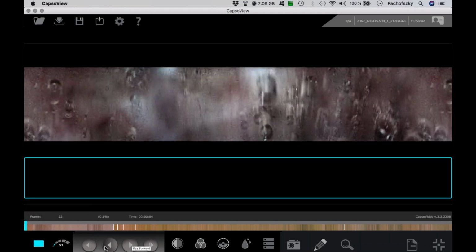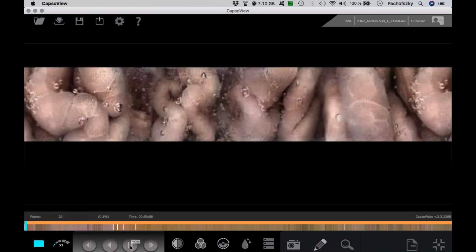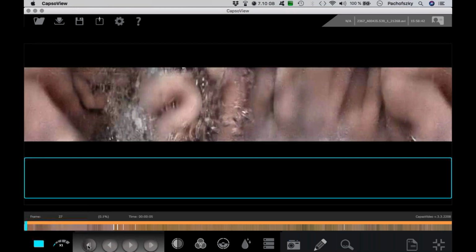So what I forgot to tell you, we have here also the possibility to mark the first esophageal mark. So we will do it. It's then in orange. And we are going down till there's a change.